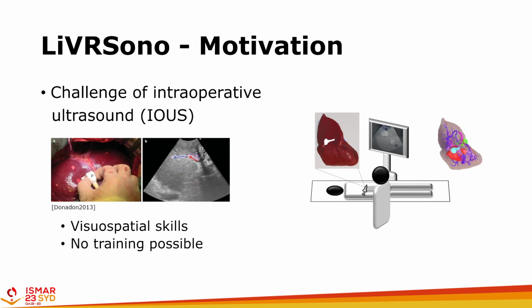There is one more challenge that makes VR training essential for intraoperative ultrasound. As mentioned before, ultrasound can only be trained hands-on, but it is not possible during surgery at the open patient. So we analyzed relevant skills with liver surgeons and defined and implemented 4 training scenarios in a VR training application.